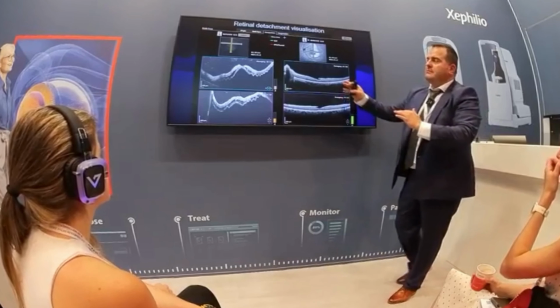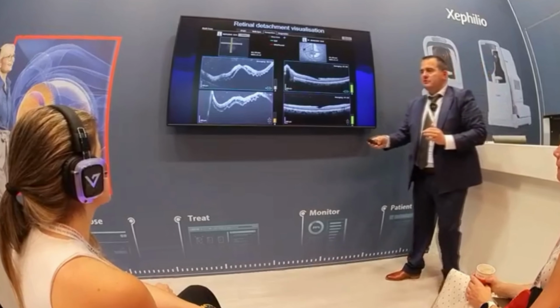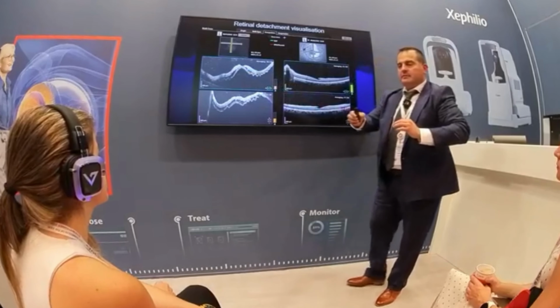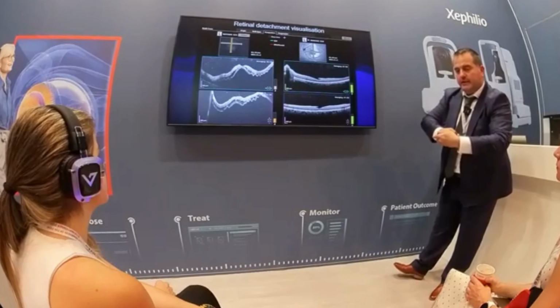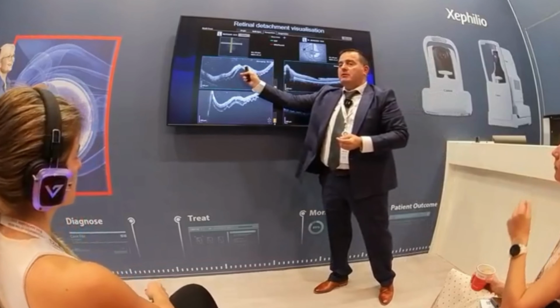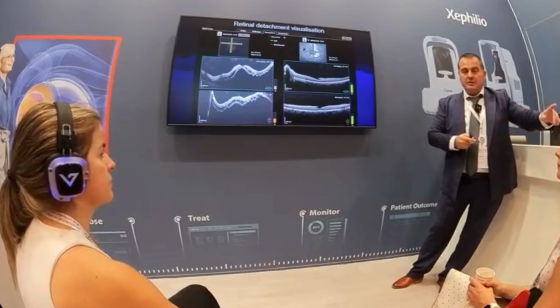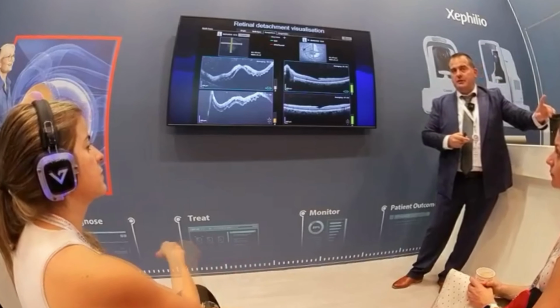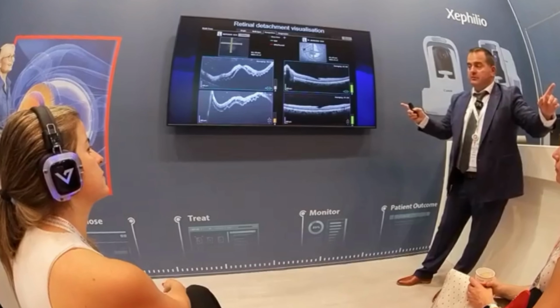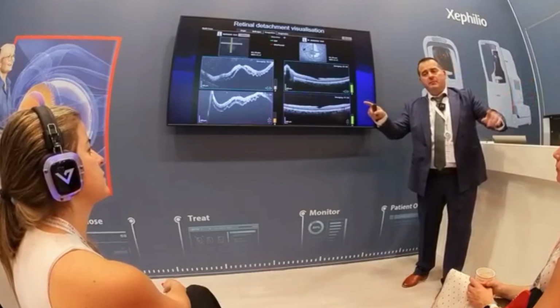So you need to use the manual mode of finding the retina and fine-tuning the image. But it's important because sometimes we are surprised by retinal detachments with macular holes. Sometimes the PVD is over the macula and we cannot see it preoperatively. If we can have this image and here there is a macular hole, it might completely change our surgical approach and also our communication to the patient, what to expect after the surgery. Because it's one thing to have, let's say, a classic rhegmatogenous retinal detachment, and completely another if it is with a macular hole, because it changes the strategy.